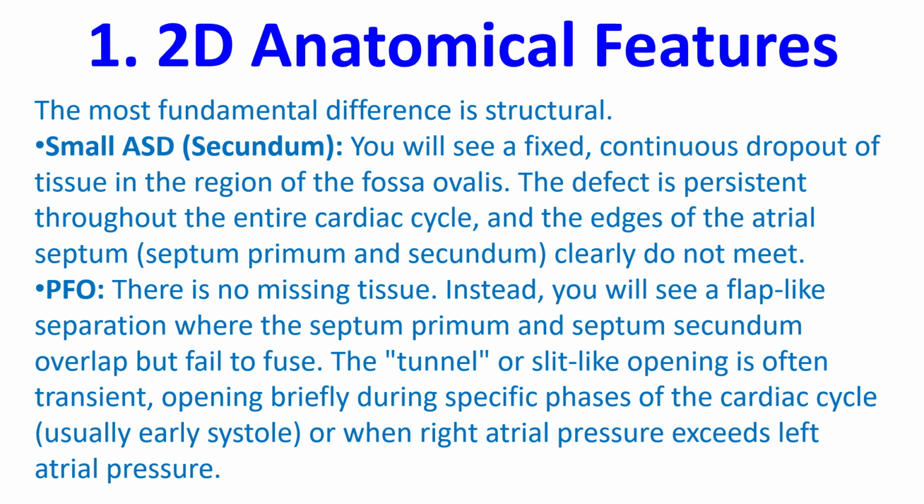PFO: there is no missing tissue. Instead, you will see a flap-like separation where the septum primum and septum secundum overlap but fail to fuse. The tunnel or slit-like opening is often transient, opening briefly during specific phases of the cardiac cycle, usually early systole, or when right atrial pressure exceeds left atrial pressure.